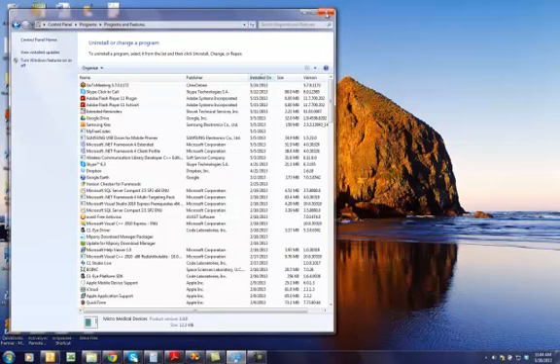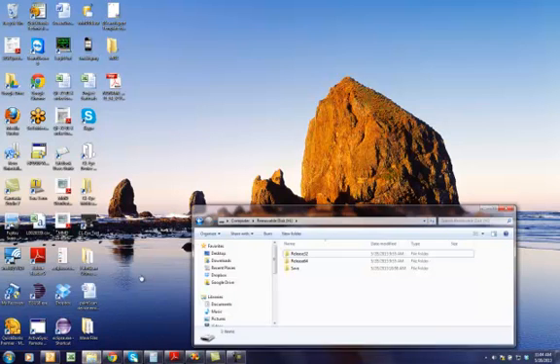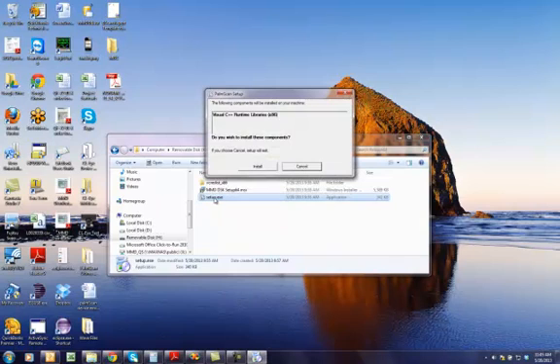Okay, the installation is done. Now that we know it's a 64-bit operating system, I am going to go to my H drive, which is a USB stick on my system, and go to the release 64 folder and double click on the setup.exe. And you want to do this before plugging in the USB mobile PalmScan into your system. So all of this has to be done prior to plugging in the USB connection.